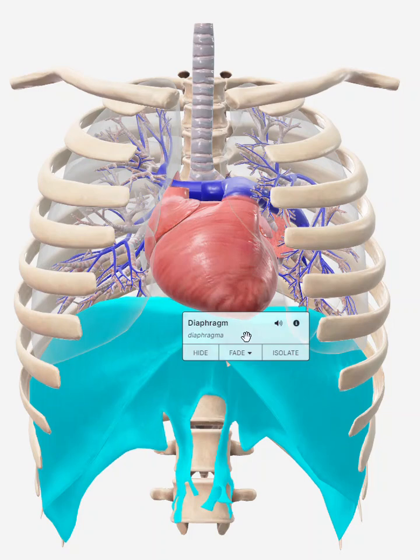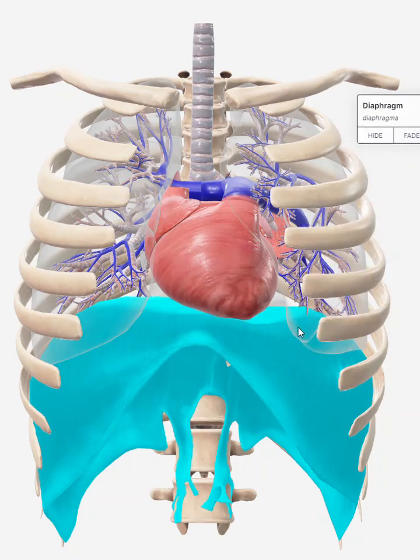And then we've got the big diaphragm, and we'll be able to see the gastric bubble. The stomach will be up here right underneath the diaphragm on the left. We'll see a little gastric bubble happening there, and we'll be able to see some gas patterns and stuff depending on how much we have below the diaphragm. We really should just get to right below the diaphragm to the costophrenic angles and not expose the patient's abdomen. So we will see the little gastric bubble of the stomach, but that's really all the abdomen we should see in our image.